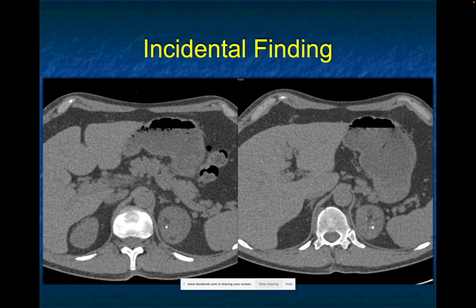Non-contrast CT, there's an enlarged left adrenal gland. Now, it looks like you can see the adrenal separate for really quick on the image on your left, but this is coming off the lateral limb of the adrenal.